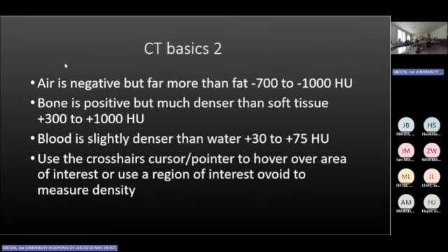Air has negative values on CT, but much lower than fat, so typically -700. But clear air, I'm not talking about lung, should be -1000.